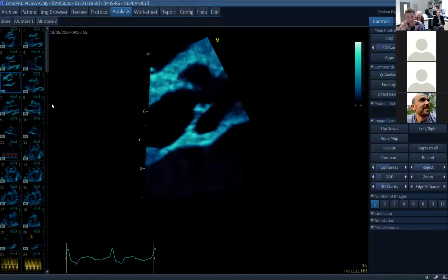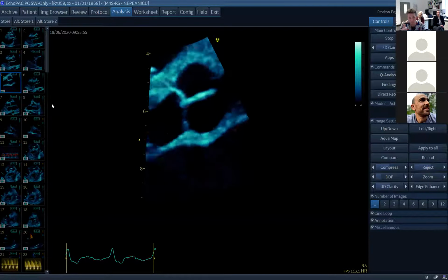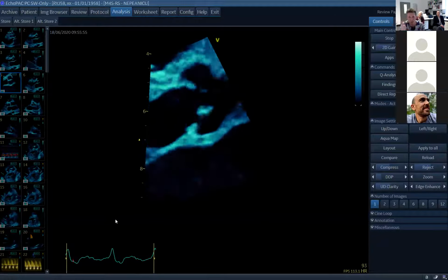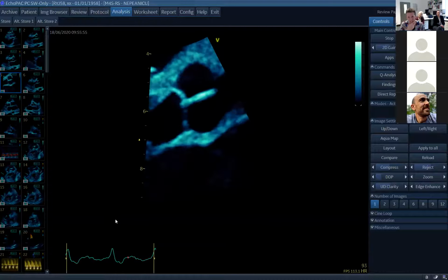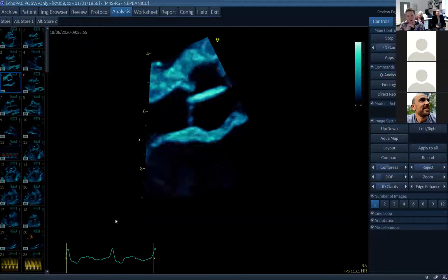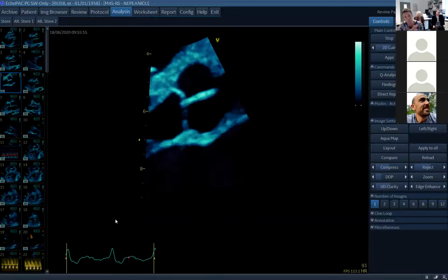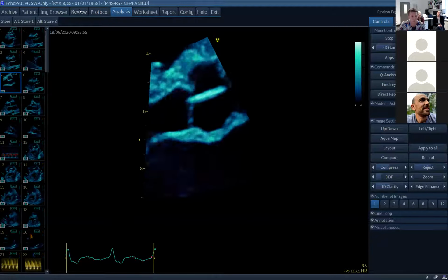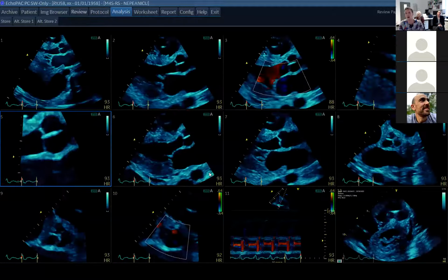And again, that's in the absence of any bundle branch block, which I guess we could argue potentially we've got here, but bundle branch blocks, mitral annular calcification, AF or whatever. Yeah. The 5-5-5 rule is associated with, not pathognomonic, but just associated with amyloid. Restrictive cardiomyopathy or amyloid? Amyloid.